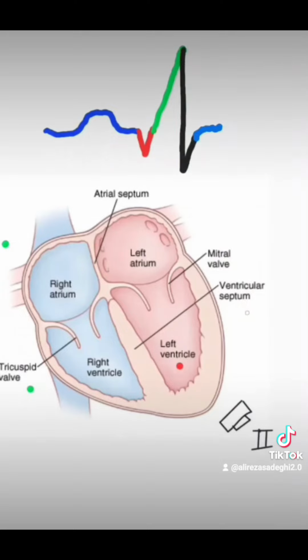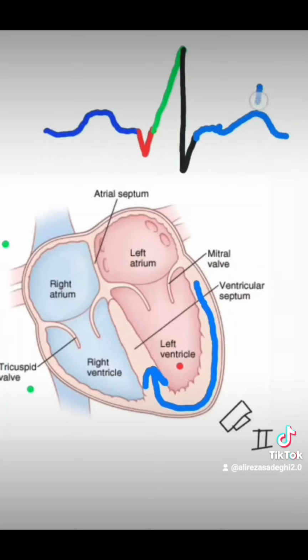With ventricular myocytes, regions that depolarized last will repolarize first. This means repolarization starts in the high lateral wall of the left ventricle, comes towards lead 2, and then it works its way exactly the opposite way around. Because this repolarization occurs towards lead 2 and then goes away from it, this is represented on the ECG paper as a first positive deflection followed with a negative deflection. This is known as the T wave.